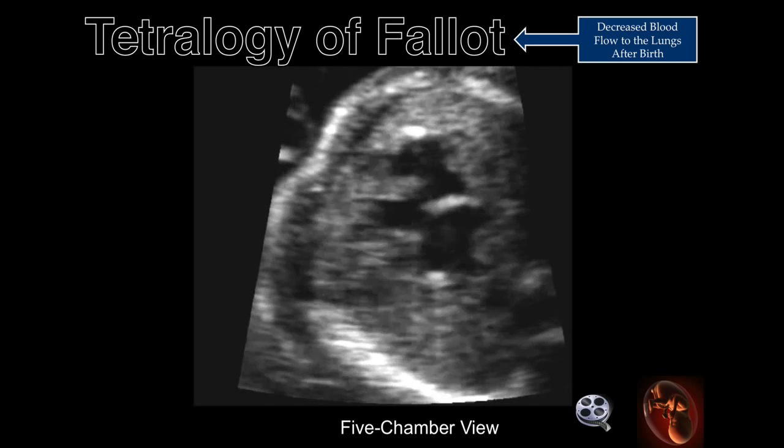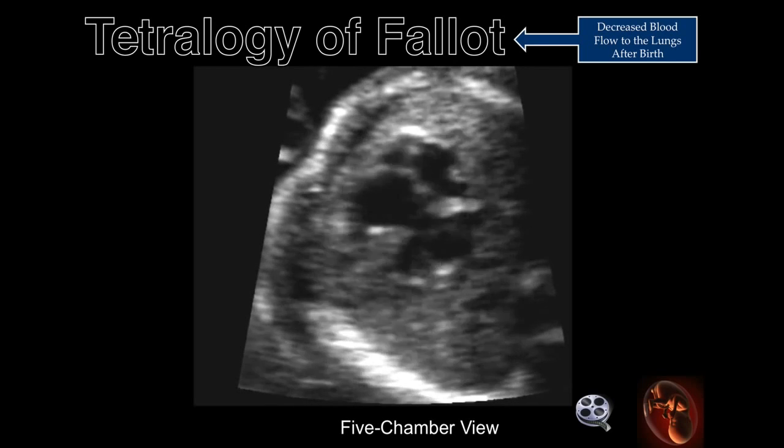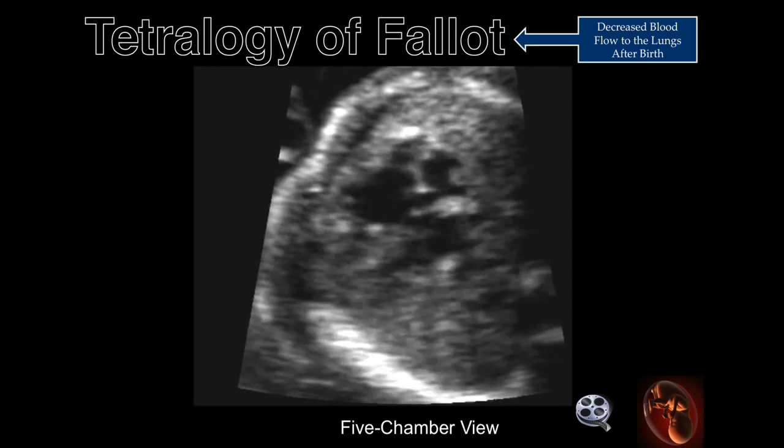This is a cine loop demonstrating the dilated aorta overriding the interventricular septum where the ventricular septal defect is located.